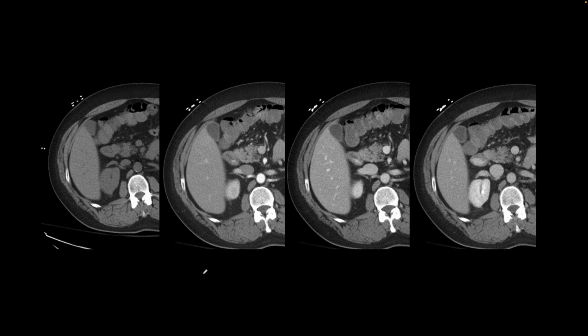Here is our next patient. They presented with upper GI bleed and we performed a multiphasic CT. On the left, we have a non-contrast enhanced image. Then we have arterial phase, portal venous, and delayed. Usually when the patients are bleeding at the time of imaging, there is contrast extravasation into the lumen, and on delayed images, it becomes more intense and moves in the pattern of the bowel.